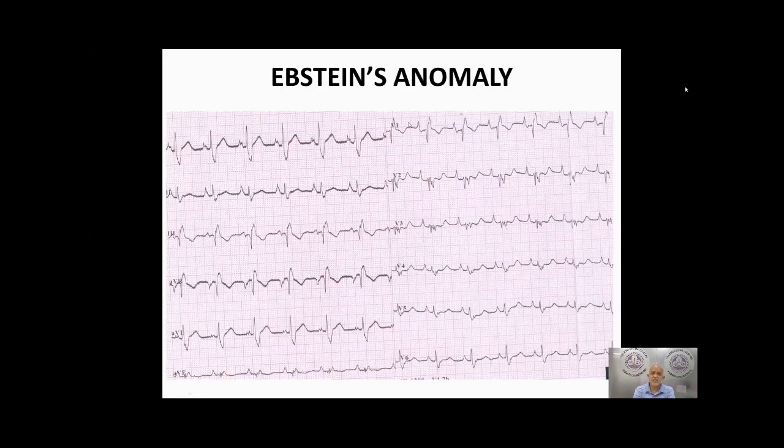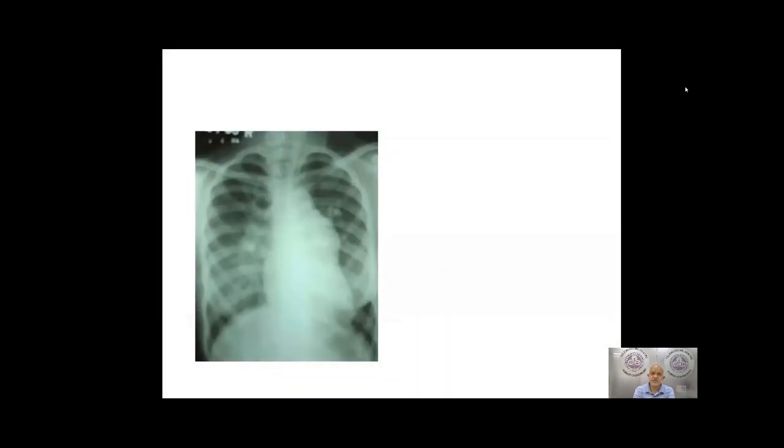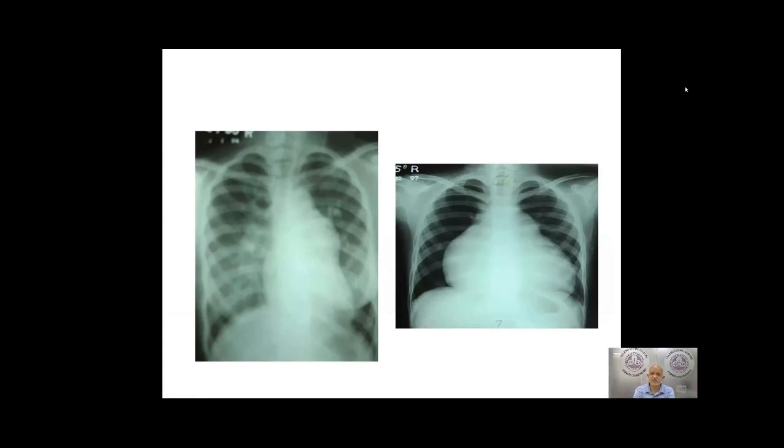This is a typical ECG of Ebstein anomaly. You can see a tall peaked P wave, a small R wave in V1 and inferior leads, and RBBB. A blue child with a tall prominent P wave, called the Himalayan P wave, very strongly suggests Ebstein anomaly. And this is the X-ray of Eisenmenger syndrome. In that, the patient has PA dilatation, normal cardiac size, and dilated RPA, but suddenly you can see peripheral pruning, we call it peripheral pruning. The mid and lateral zones are cut off. So this is very strongly severe PH, and one of the diagnoses will be Eisenmenger syndrome.